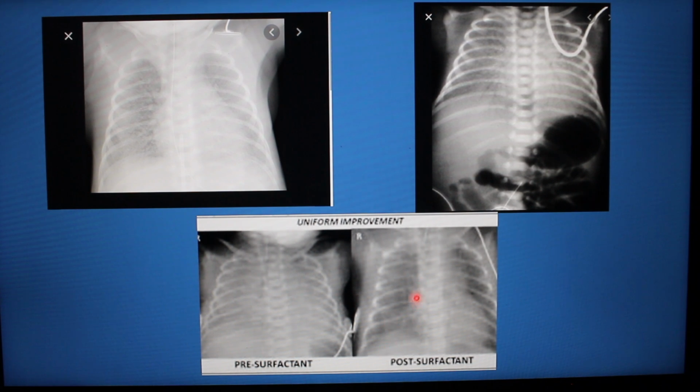We can see the heart borders much better. And you can see that the alveoli are starting to open up. We're getting some darker lung tissue here. ET tube, still a little high. We're up here, clavicles are here. Carina, I think it's hard to see, probably about here.